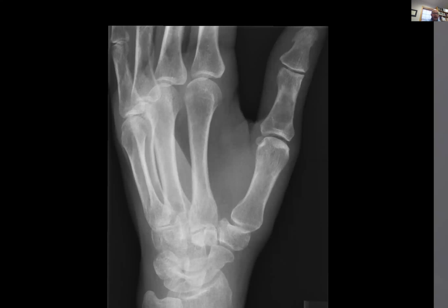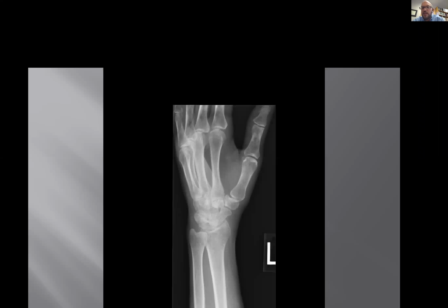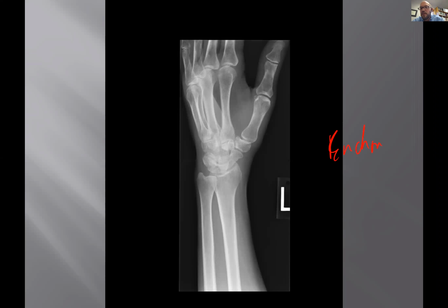Enchondroma. Now, the problem is this, guys. Enchondromas, they don't hurt. And the history on this person was thumb pain. Now, you could have thumb pain from degeneration in these articulations, or maybe they jammed their thumb. I understand that. But if you poke in that bone and it's a deep, achy kind of pain, consistent, not constant, but always bugging them, then that means that lesion's probably hurting.